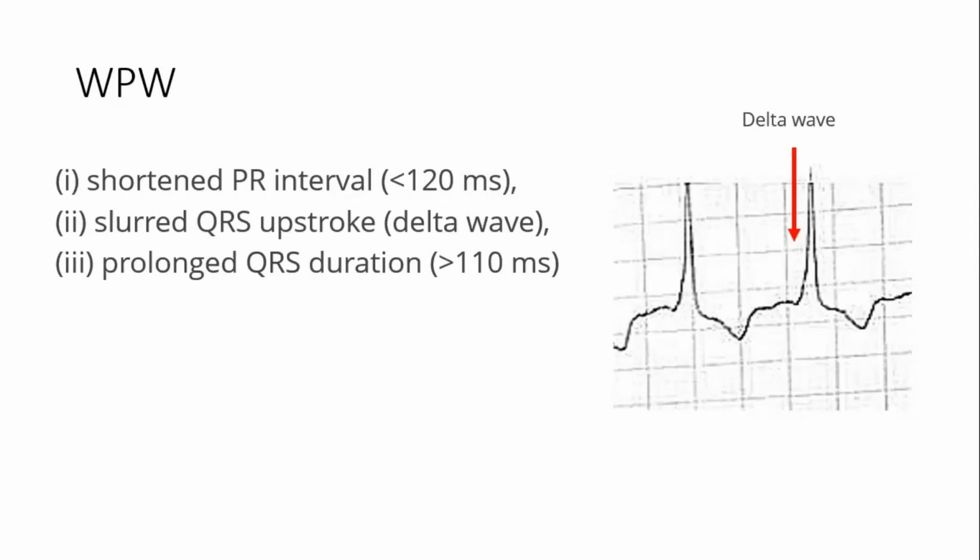So why is it slurred? That is the question. Because of pre-excitation. We know that it's a pre-excitation. Anybody else who would like to comment? Can help her out.